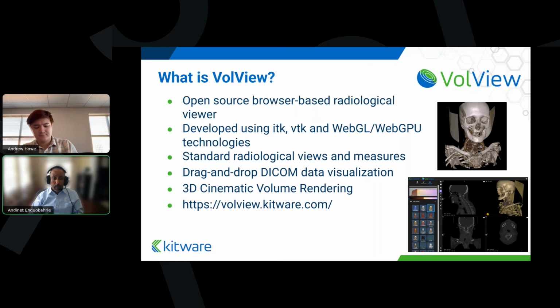And the best part is you can just go straight to volview.kitware.com, and we have a free hosted version there that you can start using. VolView comes with some sample data sets bundled with it. So you'll be able to just click on one of the sample data sets, visualize it, and interact with it. But of course, we'll be showing a live demo of VolView, and we'll show you how the different components function.